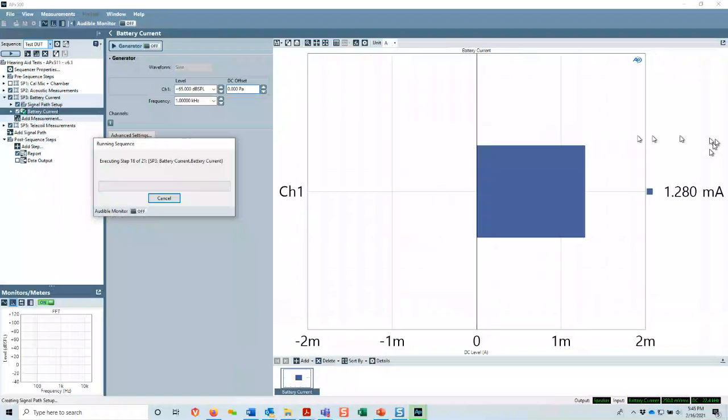So with these telecoils, the loops, the position where the strength is a maximum can vary from box to box, and you're supposed to position the hearing aid at the point of maximum. In this case, I'm just going to leave it where it is. It's close enough for demonstration purposes, but I'm going to switch the hearing instrument to telecoil mode.